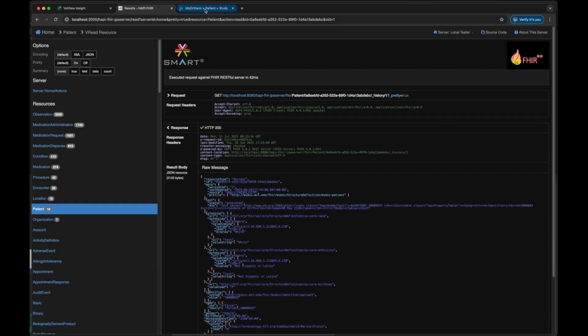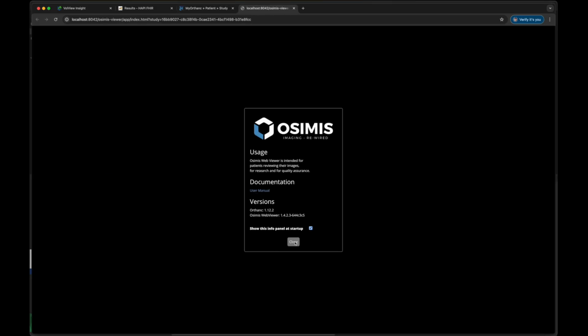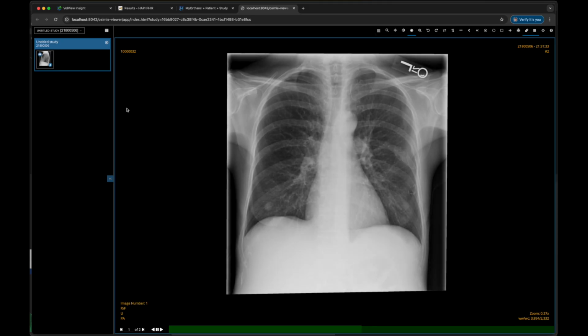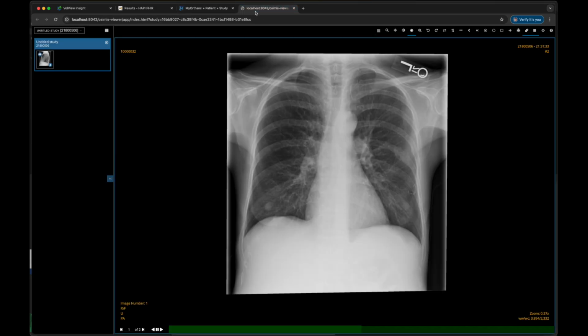Similarly, here I'm running an Orthanc server as a PACS. You can imagine that a radiology or cardiology clinic would have their data stored in a PACS similar to this one, either provided by their EHR vendor or separately. Our platform exposes the necessary endpoints to ingest the imaging data into the clinical viewer. Now, let's look at the application itself.